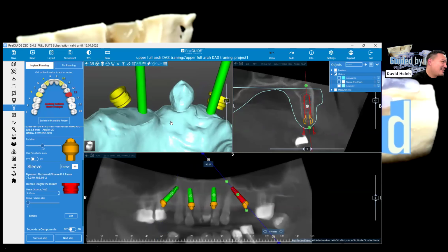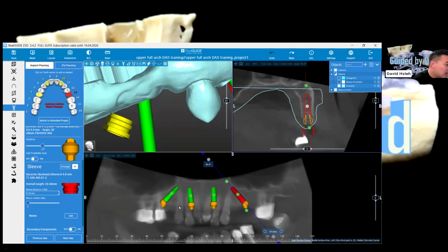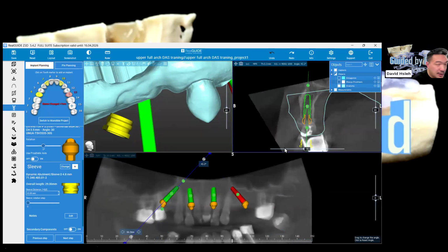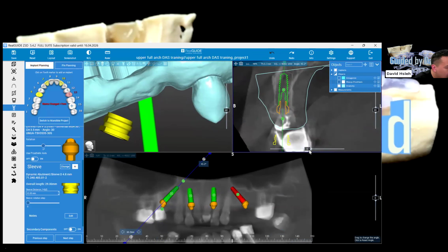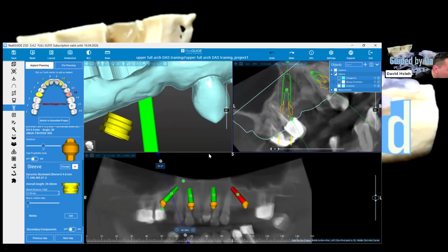Hopefully it's not too much. Ideally you don't want to increase too much, because the further they are, the greater the projection error, which means the accuracy of the guided surgery will decrease a little bit. So just pay attention to that. Just increase a good enough amount, not too crazy, right? Let's just say we're happy with it for now.